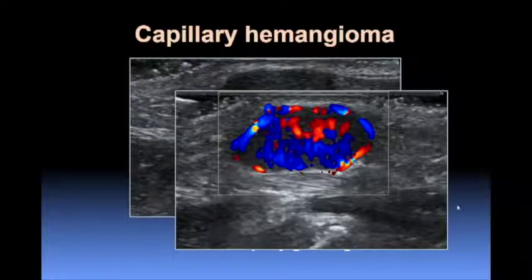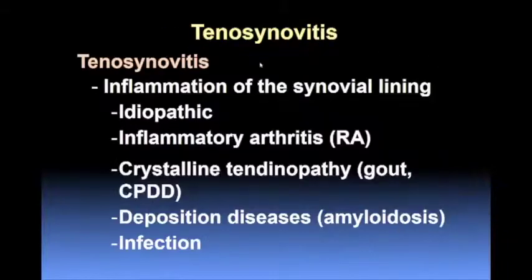So I guess patients and lesions don't read the textbooks, so be aware. There may be other diagnoses as well. You know, we certainly don't want a patient to wind up with a sarcoma, but you do have to consider that. And now I throw capillary hemangiomas in my differential, but mention that typically these don't rapidly grow or hurt, although this patient's did.